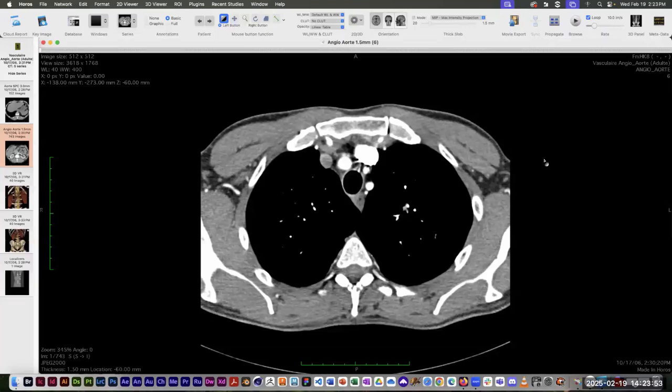And I do all of the segmentation in the 2D viewer because it involves actually identifying and isolating a structure on each individual 2D slice. And then I'll show you the trick for then separating that from all of the surrounding structures and exporting it as a model. Horos has three different ways of doing segmentation.